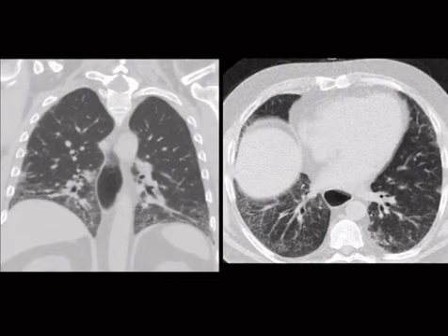this. This is the scleroderma case. This is how they love to show this. Dilated esophagus with this faint ground glass sort of looking stuff. If you see a dilated esophagus and they want to know about ILD, it doesn't even matter if you can see the lungs or not, you know it's NSIP.